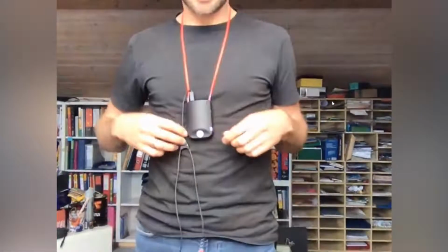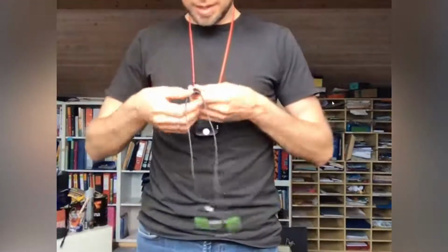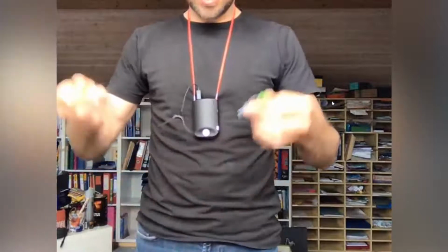And you will wear it like this, so you put it around your neck. It's lightweight, and then you can mount the hearing aids in your ears, and now you're wearing it like a real hearing aid and having hearing aid processing, but at the same time full control over all the stuff as a researcher. With this device, you can prototype the hearing aid algorithms of the future and test them in the wild.